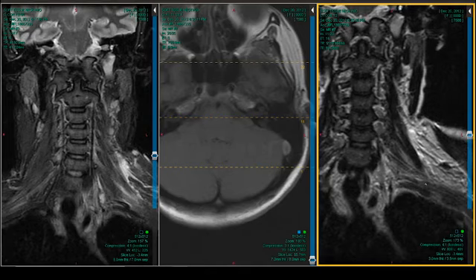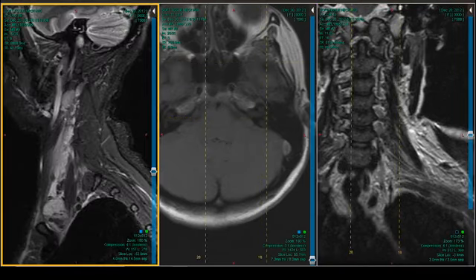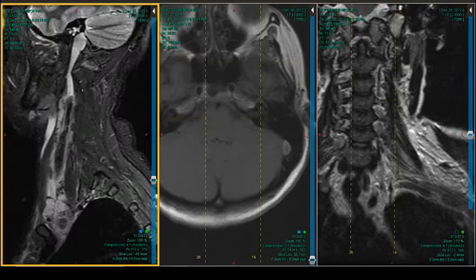Because, as I say, if you see a brain scan and it hasn't infarcted yet, it's really easy to miss, like Dr. Pomerantz was talking about earlier. I comment on the venous sinuses and the jugular bulbs on every MR of the brain, particularly in a young female, because that's who gets these clots. And if you miss that, they come back the next day and you say, oh, they're not waking up now. Yeah, I should have shown this.